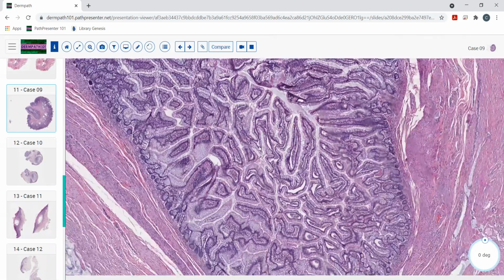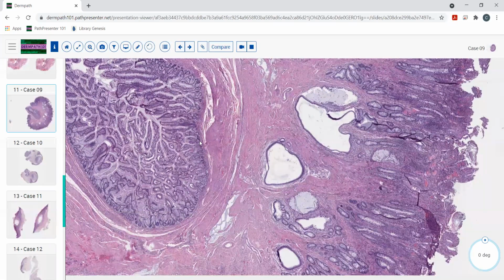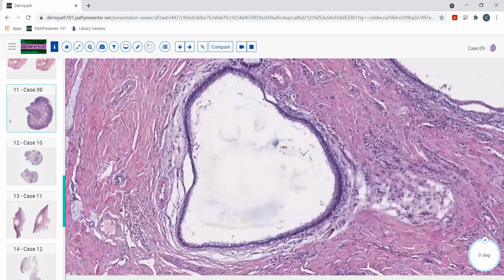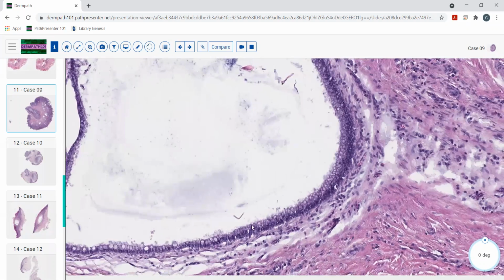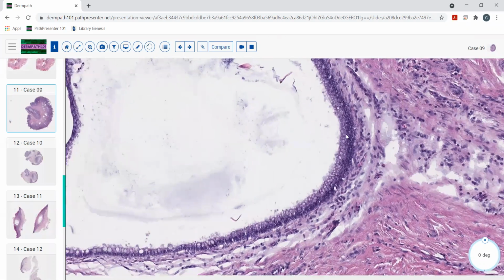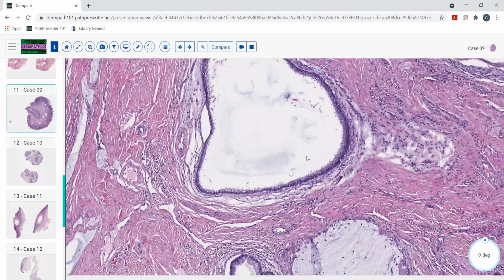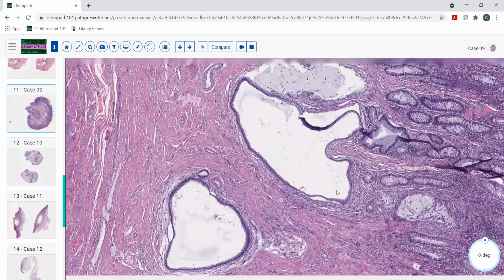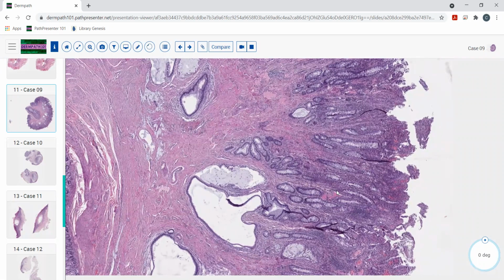And so it's got a papular morphology to it. It's got a cystic, well, it's not cystic, it's a true cyst, but it's lined by GI epithelium with all these goblet cells in here. So this is a nice example of this cyst here with this true lining. And when you see something like this, you say, wow, this is relatively rare and unusual. This actually often occurs in children. It's seen in the area around the umbilicus. And basically, this is an omphalomesenteric duct cyst.